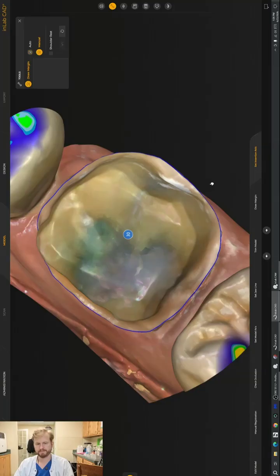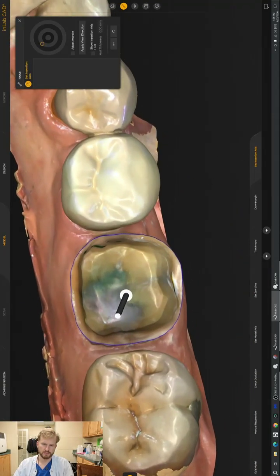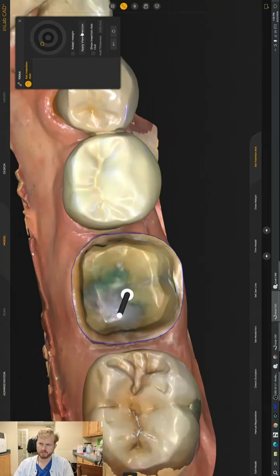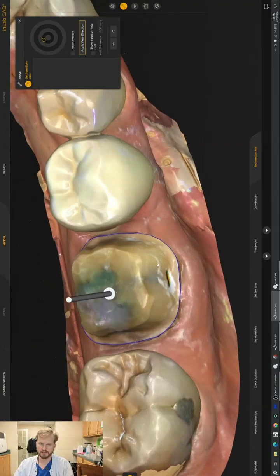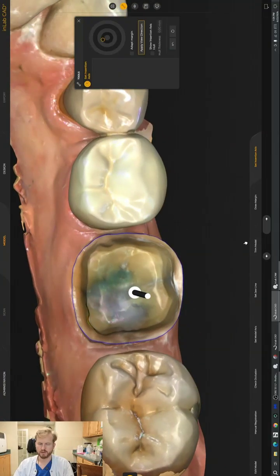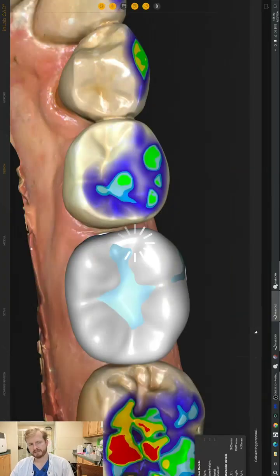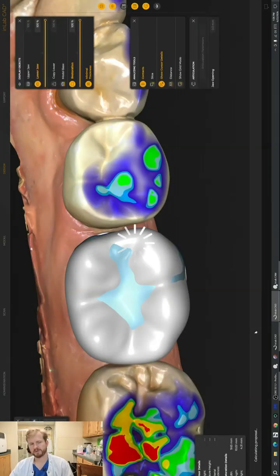All right. Insertion axis, something like this. Click apply. That'll do. Go next. Spacer 120 microns, so we have room to bond. Edit element asks the computer to give us a proposal.